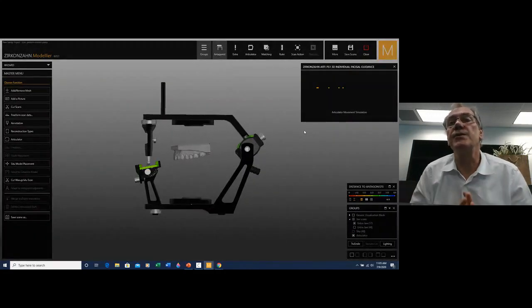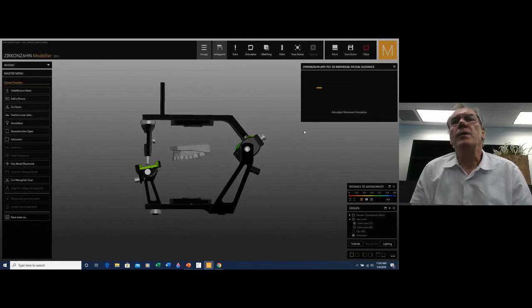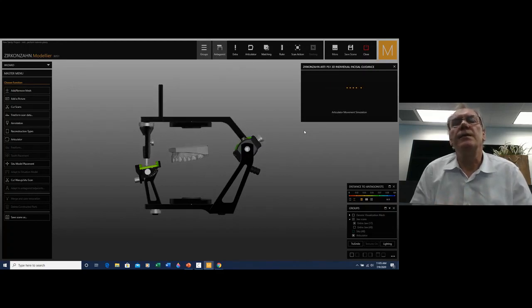So working with these digital articulators is much, much easier than working with the actual physical articulators. I have a broad view of everything in relation to the mapping of the movements. And whoever does these types of procedures in the manual world or in the analog world really knows how difficult it is. And if you have to compare the two techniques, certainly you'll put your eyes on how we can perform these types of procedures through a digital articulator.